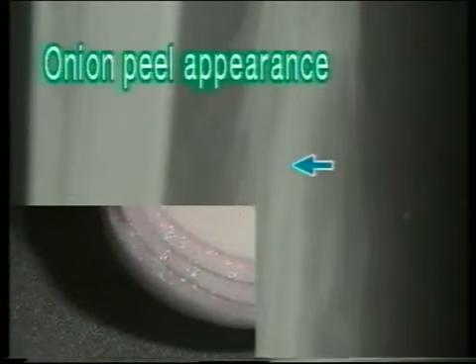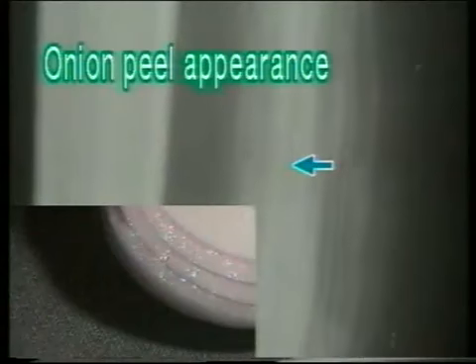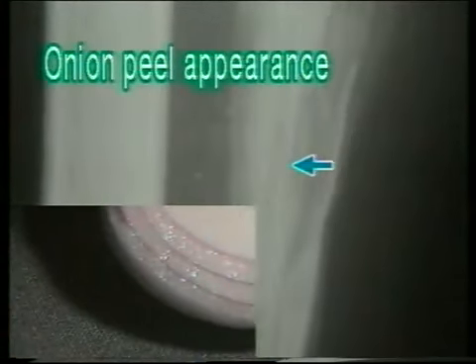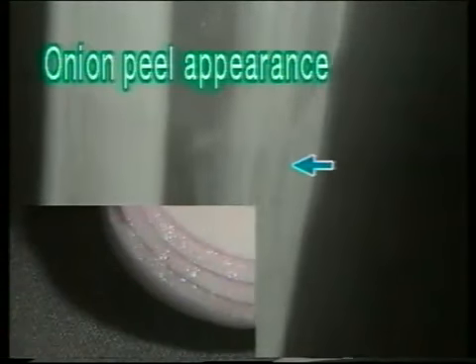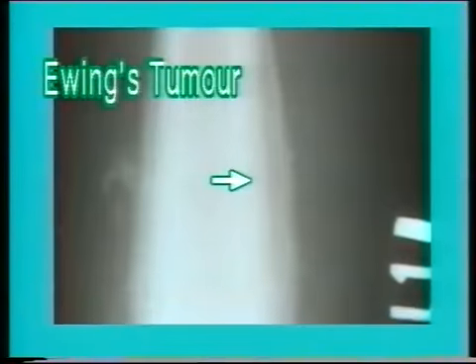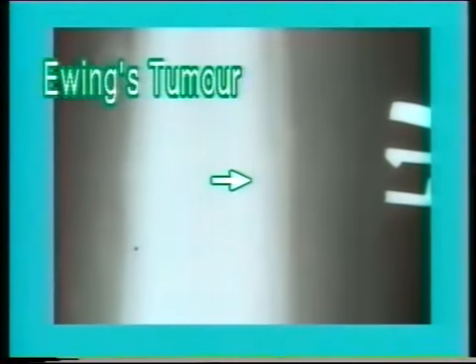Watch again in a close-up view the typical onion peel appearance. A diffuse bone formation may also be seen in the soft tissues. This is another X-ray of the shaft or diaphysis of the femur. The close-up view shows a typical onion peel appearance. The layered bone formation is the characteristic of a Ewing's sarcoma.